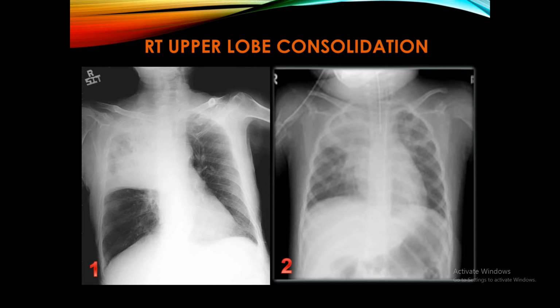فإذا نرجع للتسلسل معنا. إذا نحن عندنا patchy opacification، وهذه patchy opacification without loss of volume، فمعناها نحن عندنا consolidations، واللوكيشن مالتها هي in the right upper lung lobe. Chest X-ray number 2 is another example of right upper lobe consolidation due to pneumonia، ولكن هنا في pediatric age group.